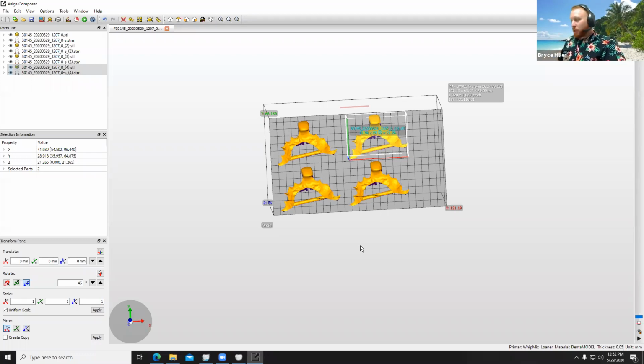Cool. Cory, do you have anything else? That's about all I have. I think this turned out really good. Thank you for showing the actual nesting.